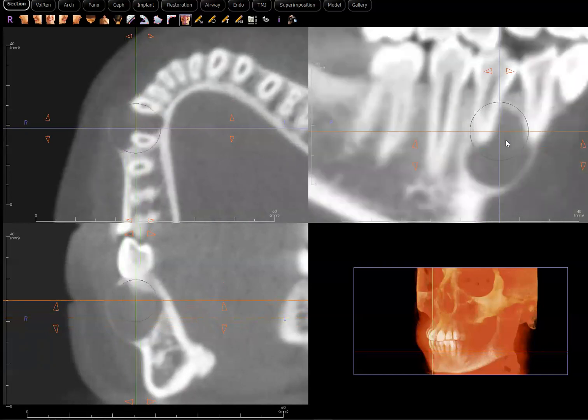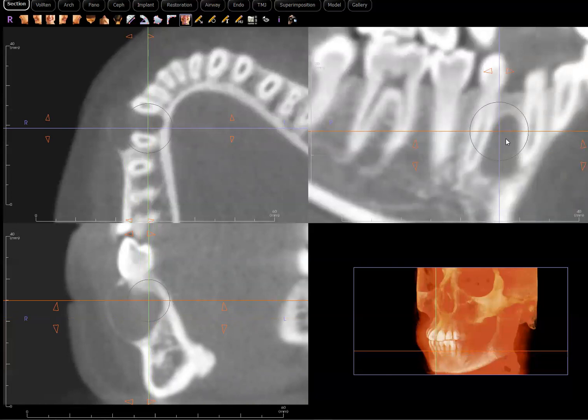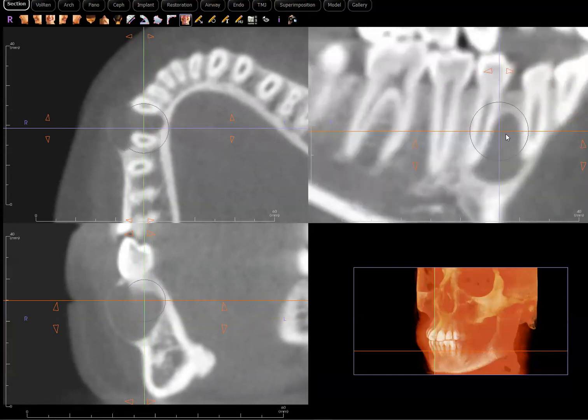So I think the ordering doctor put lateral periodontal cyst as a differential, which for this patient's age, since we're looking at a teenager, is a little ill-fitting. In the sense that lateral periodontal cyst occurs in an older patient, 40s or older, and their size tends to be usually 10 millimeters or less, although there's a variant form where it can appear multilocular and even much larger than 10 millimeters. But a classic lateral periodontal cyst could be in the premolar region, and is a very well circular radiolucency, less than 10 millimeters in diameter. But I can see why the clinician may have included lateral periodontal cyst, since the tooth, I presume, is vital.